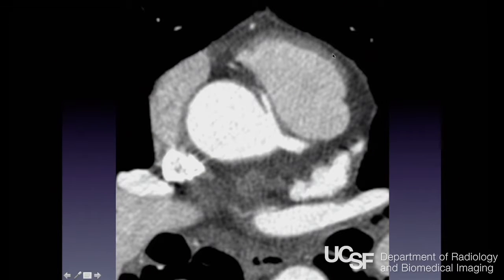So here we have a coronary artery, which looks like it's coming off the wrong spot, right? Here's the left. This actually turns out to be the right that's coming off in a weird location. So here, let me draw, this is an anomalous coronary, and it's important to know all the different subtypes of anomalous coronary because some of those are associated with risk of sudden death and others are not.